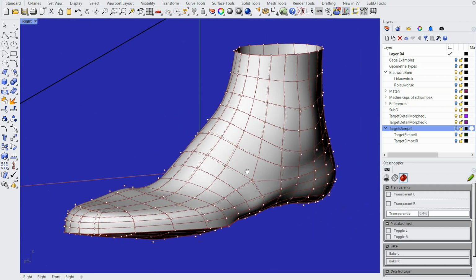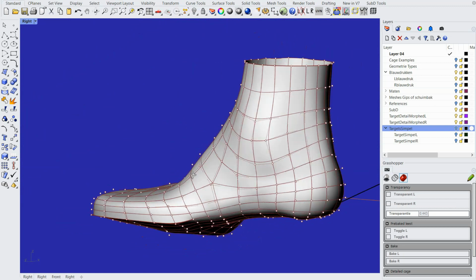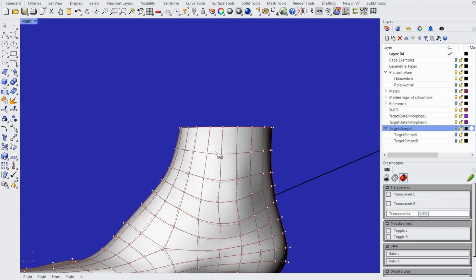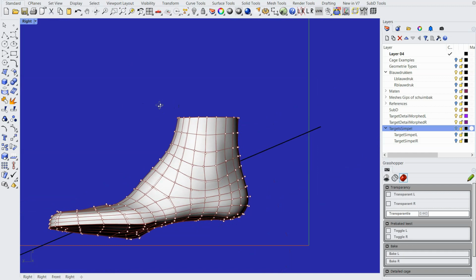Looks okay. Now what I also want to do is to make the top surface exactly horizontal. That's quite easy while making the shoe. When you make the heel of the shoe, you have a reference surface that must be horizontal.